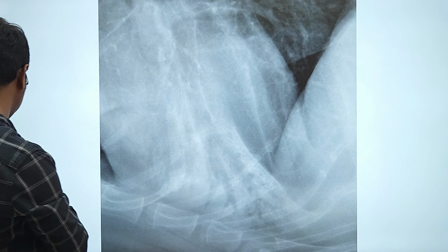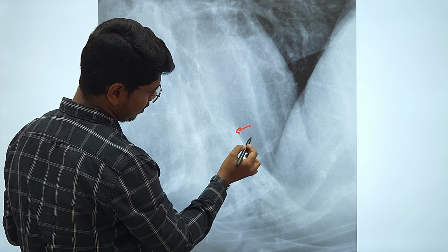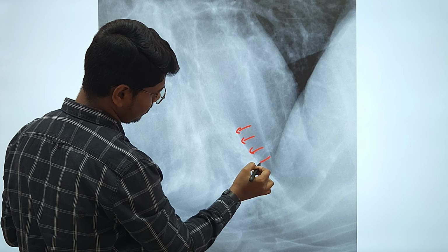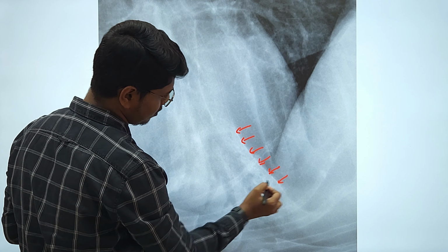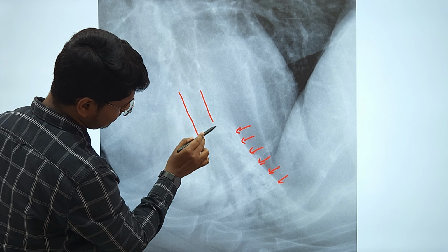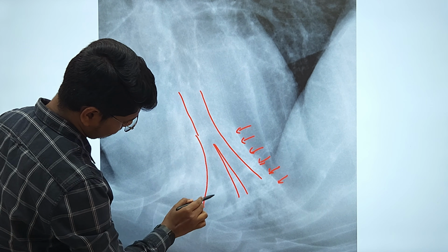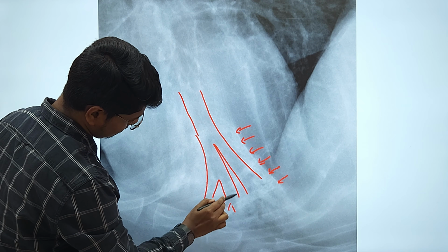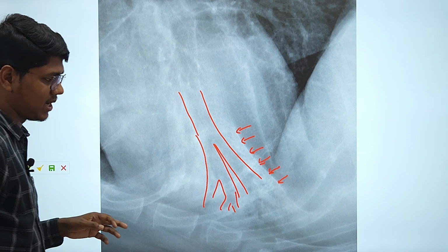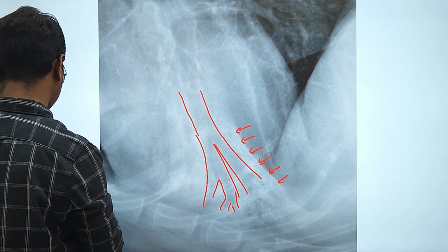So here is a radiograph. Can you see a lobar sign here? This one is the normal lung, usually the middle lung lobe. Can you see this lobar sign? And can you see the bronchogram? Here is the bronchi, you can see it going like this. This is air bronchogram along with the lobar sign. This is characteristic of alveolar pattern.